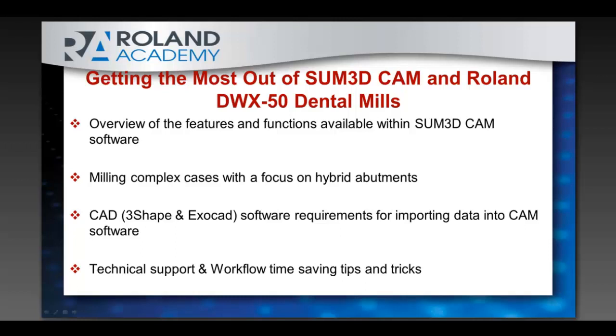Again, my name is Mike Webb with CIMsystem. I'm working out of the CIMsystem USA office in Louisville, Kentucky. And today we're going to show you a couple different features of the software that can help you save a little bit of time. And of course, this is going to be focused around hybrid abutments as well. So you're going to get to see how to process those into the CAM software.